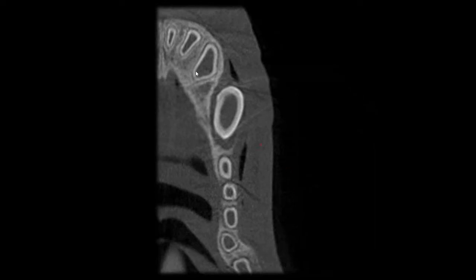Here's a cross-section of a young dog. We'll look at that CT scan again in just a moment, but I just want to briefly show you what this cross-section means. The right side of the screen is buccal. The left side is palatal. And here again, we're looking at a cross-section of normal anatomy, although it appears at first that there might be some bone loss. But just remember that this cross-section in the axial direction is at a level where bone is no longer visible, because we're cutting through the anatomy at a more coronal aspect of it.